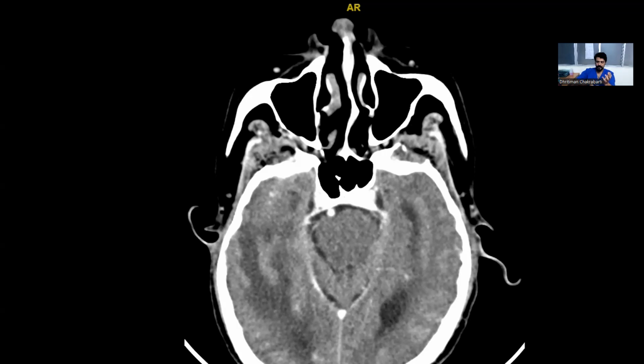Now, when you take cut sections, because there are many indentations inside the brain and everywhere CSF is filled up, it will appear like those CSF filled areas have a defined shape. Actually there is no shape. But based on that look on the CT scan or an MRI, we define them as specific cisterns based on their location.